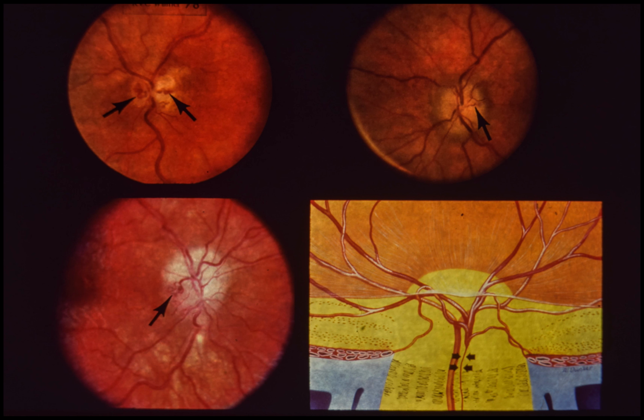Lower left. This 12-year-old female had chronic papilledema from pseudotumor cerebri. Despite therapy, visual acuity in her left eye decreased to 20/400. The left optic disc is pale, and there are several optociliary shunt vessels on the surface. It has been postulated that constriction of the central retinal vessels by a slow-growing retrobulbar mass or by chronic increased intracranial pressure fosters the development of bypass channels within the eye.